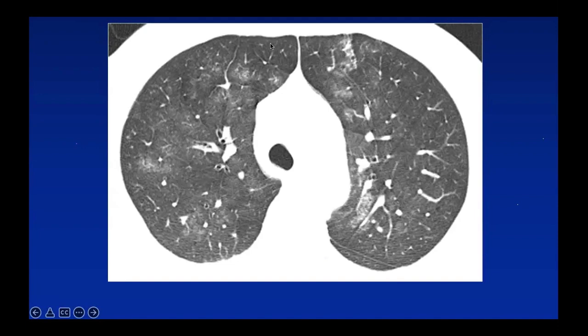You cannot compare the non-dependent lung with the dependent lung because there's going to be more blood flow here and the vessels will be larger. But you need to compare adjacent areas of lung. Are the vessels similar in size? And I think here they probably are. And I'm saying probably because this is really difficult to differentiate. So that's the official definition. I use another definition that is much easier, which is if there is sharp demarcation between the white and dark areas, that is mosaic attenuation.